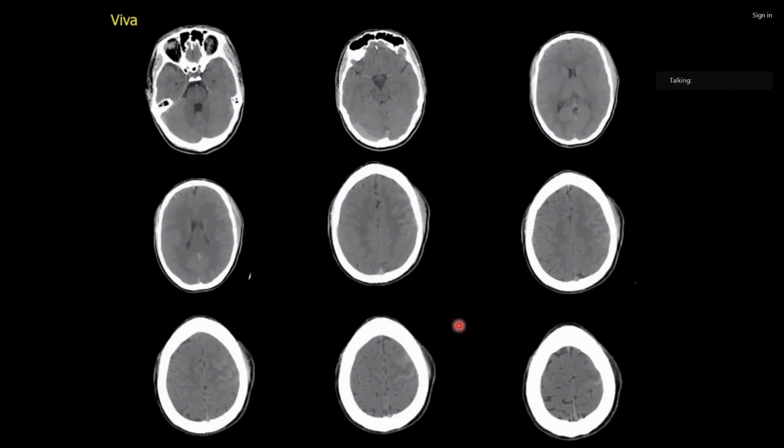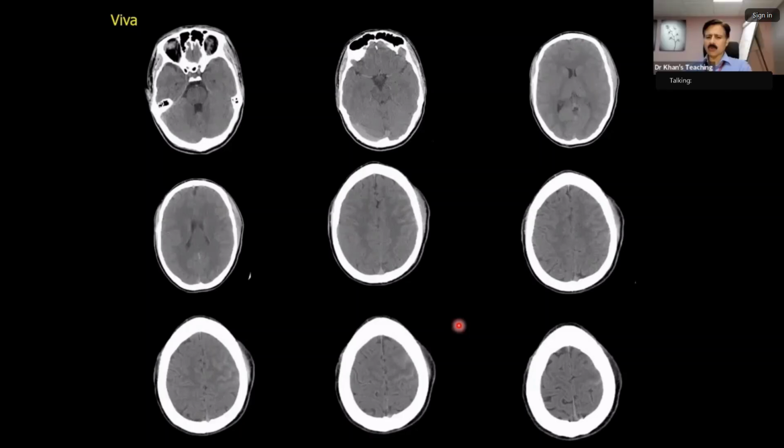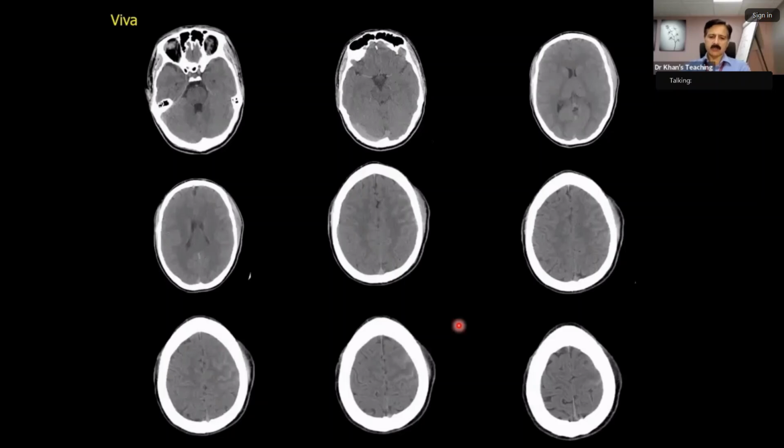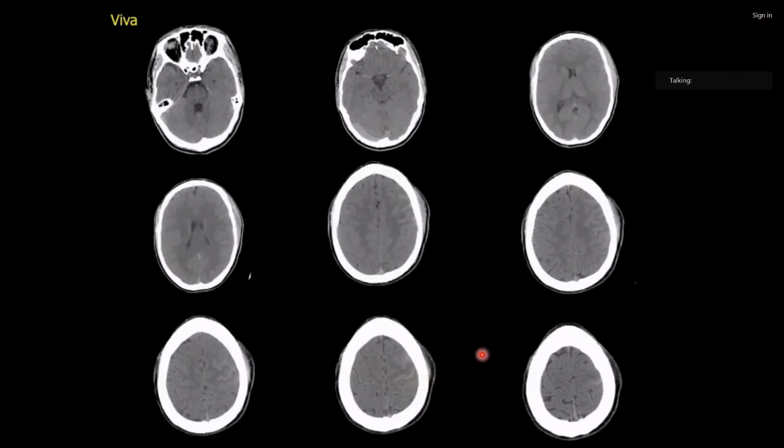Yeah, there could be calcification, gyral fold calcification. Look at the density. It's not that high. Yeah, you're right. Calcification will always be more than 80 Hounsfield units. If you see this, this is something like the gray matter. It looks more like hemorrhage to me.